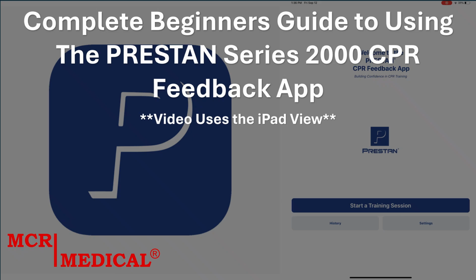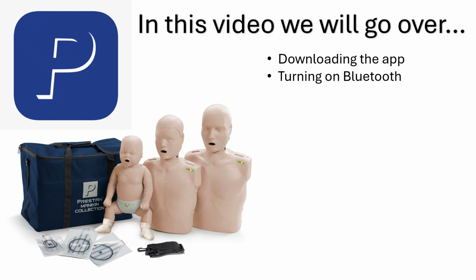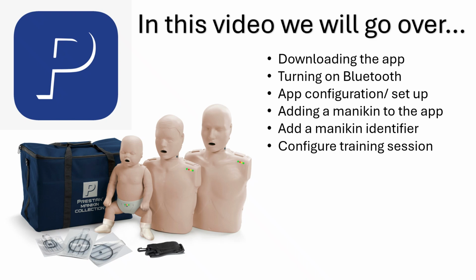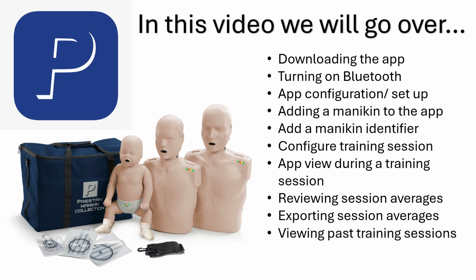Let's get started. In this video, we will be going over how to download and set up the app to work with Bluetooth, how to configure the app after opening it for the first time, adding a new manikin to the app, how to add manikin identifiers to the newly added manikins, how to configure any given training session, what you should see while administering a live training session, how to review the data after, how to export it, and then how to view past sessions.